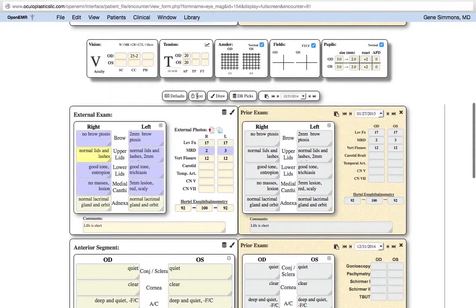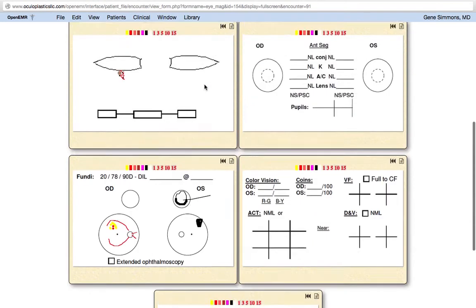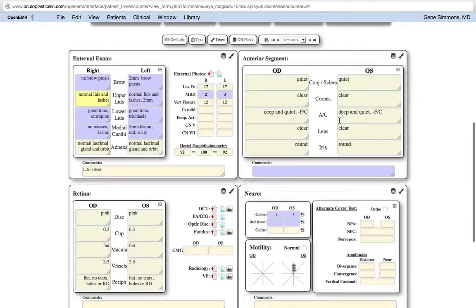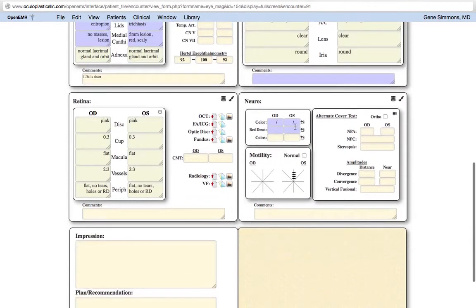Go back to text, just because it's easier to look at compared to this one, which is the draw. Text versions have a database function or connectivity to an image document database. If we wanted to upload a photo, we'd do that. It would open the EMR document upload section. This is for reports. It's not generated yet, and this is for the images. If we want to look at those images, we will click, a new window will open.